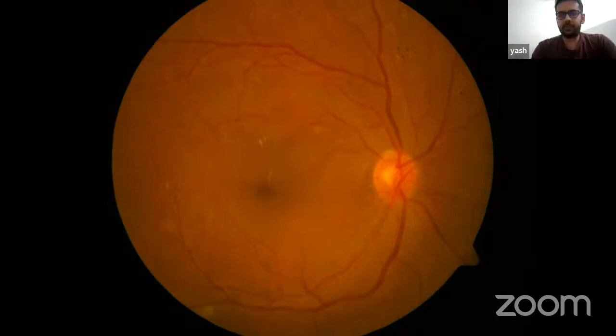Based on this image, I'm saying that the vessels elsewhere look pretty much focused, but around the macula, it is looking a bit not in focus. That means it is a bit elevated, and that is pointing towards some sort of a macular edema happening here, sir. It is actually not out of focus. Actually, what edema does is it makes the capillary network in that area less clear.